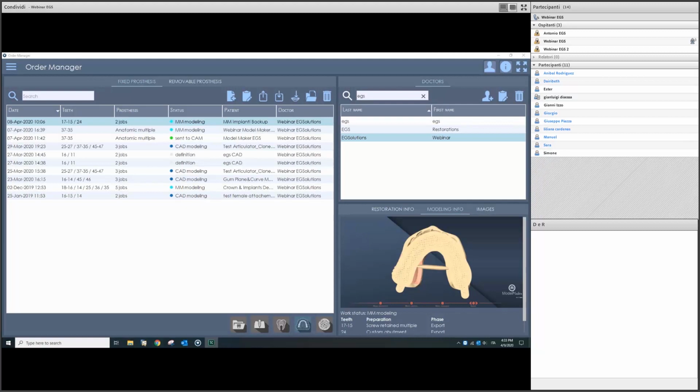So in this webinar, I will provide you an overview about our DentalCad software, and we will see the complete workflow related to the implant job, so model maker and CAD modellation. I think that we are ready to start.